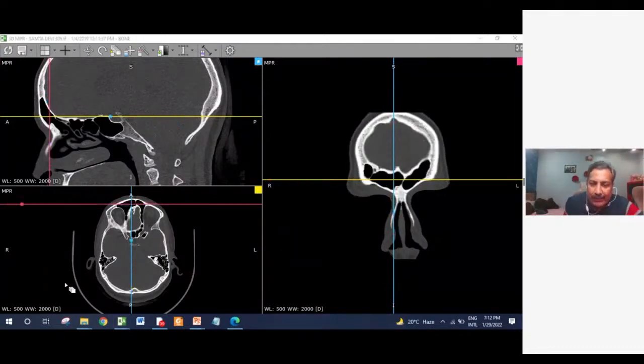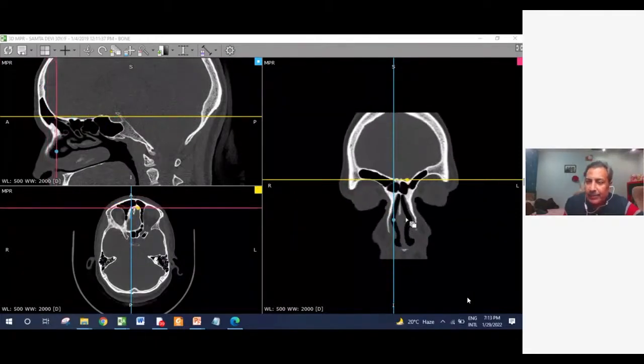See this, I want this area, right from the anterior part of the nose to behind the frontal sinus, right from top to bottom, right from anterior to posterior, in all three planes, that too in dynamic fashion, which is impossible in printed format. So we must always order our patient to get this information in the digital format, number one. Number two, we must order fine sections, otherwise a radiologist or a technician can do 5 mm sections in a second's time to save the slices.